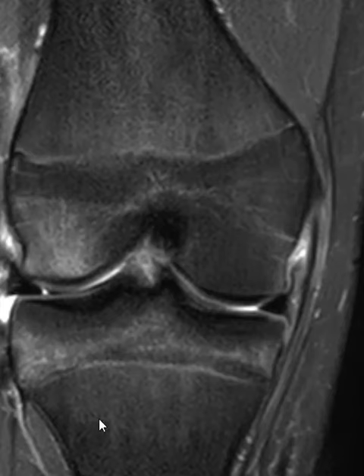Hello, this is Dr. Gay from First Look MRI, and I'd like to show a few images of a patient who has a tear of a component of their medial collateral ligament. It's a good example of some of the anatomy here.